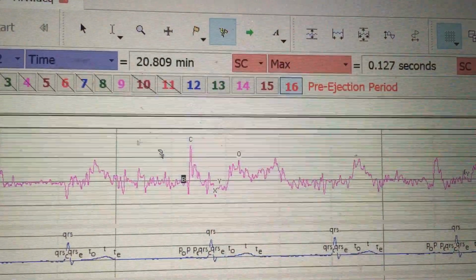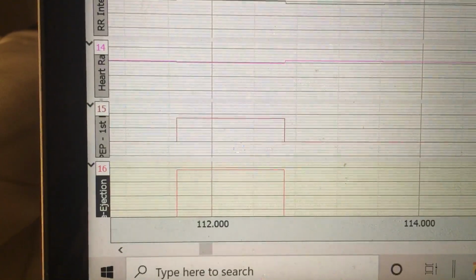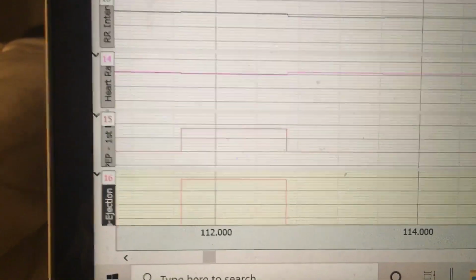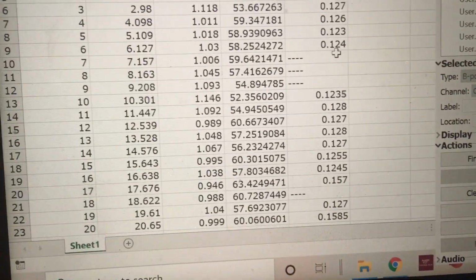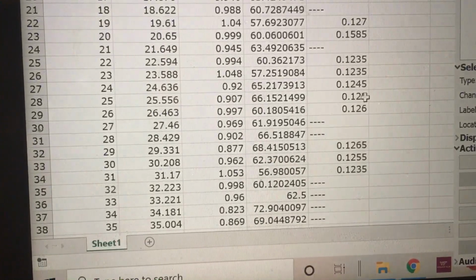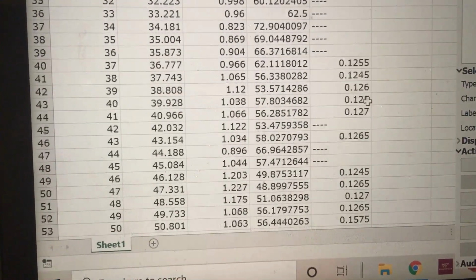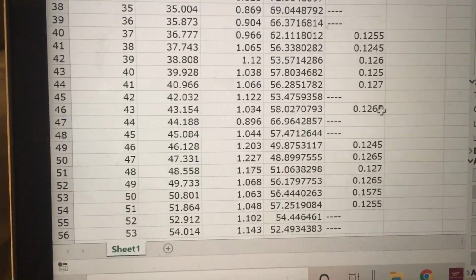So I'm going to have to take that and get rid of it. Now I could do that, or since this is the only mistake, I can keep that in my mind and flip to my Excel spreadsheet. And if I can find the thing, and remember in the sequence where that outlier was, simply delete the outlier out of the Excel spreadsheet rather than having to recalculate PEP a third time. So those are a few different ways to go about cleaning.